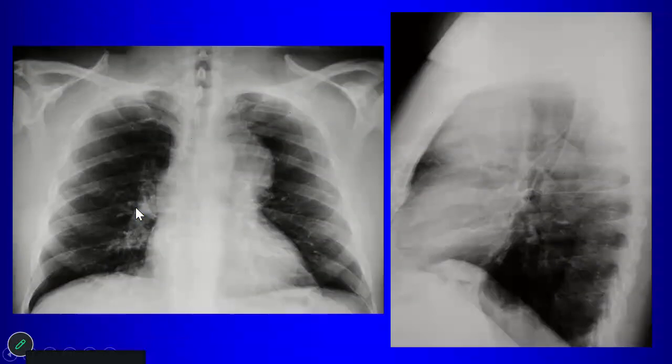the lateral. There's your lateral. Where's the mass? Anterior. There it is. What is your differential for this? Thymoma. Okay, so you could start with thymic lesions, right? Do we like thyroid for this? Possibly. No. Possibly, no. Which is it? No, we don't like thyroid.